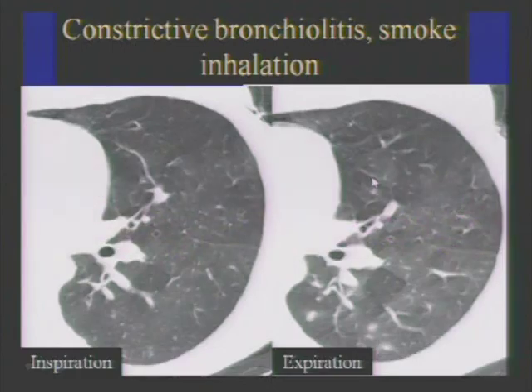Here's a path example of constrictor bronchiolitis. This is, I believe, in that category where if a pathologist sees a normal exam in someone with symptoms, this is one of the diseases that can produce that. These findings can be extremely subtle on path, and thus we often don't see them on CT scan. But that's where the smooth muscle should be, and this is an airway at the center. In this case, this is mostly fibrosis surrounding that airway. And this can be very, very subtle on path, and we can't resolve that airway fibrosis on CT scan.